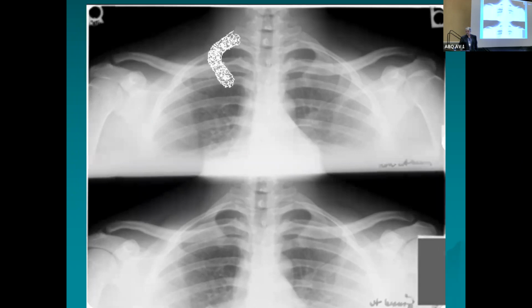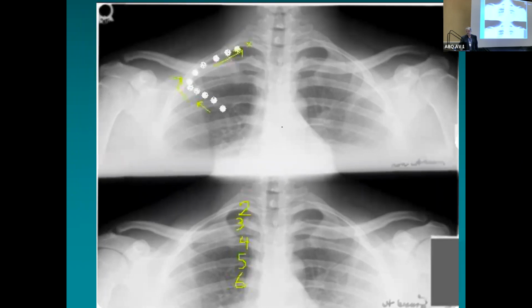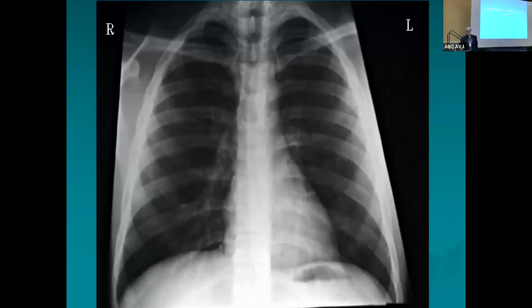Okay. I let that one in just to show where 1 is at. Find 2 to find 3. Let's see if we can count some on our own. This is a good film right here, even though it's hard to see. Boy, it really is a difference showing up right here versus here. How many ribs can you see first off? I'll give you a hint.